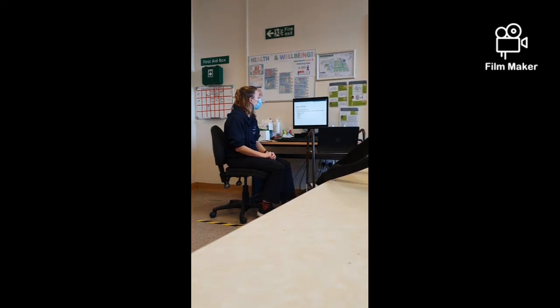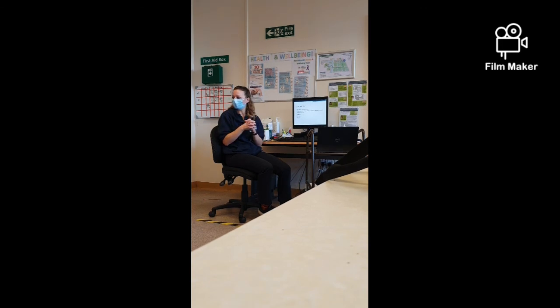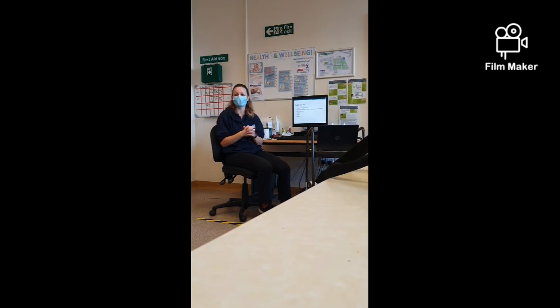Right, okay. So everyone's happy with the A to E approach and how to look at it. So every chest X-ray you would do A to E. But what do we need to remember first when we look at a chest X-ray? What do we need to remember to do that we weren't able to do today? Check the name, details of the X-ray. Yeah, name, details, and then what? Can you remember what right was at the beginning? If we're thinking about how the X-ray has been taken, or if there's rotation. If it's AP or PA, position, if it's under or overexposed, yeah, your position.